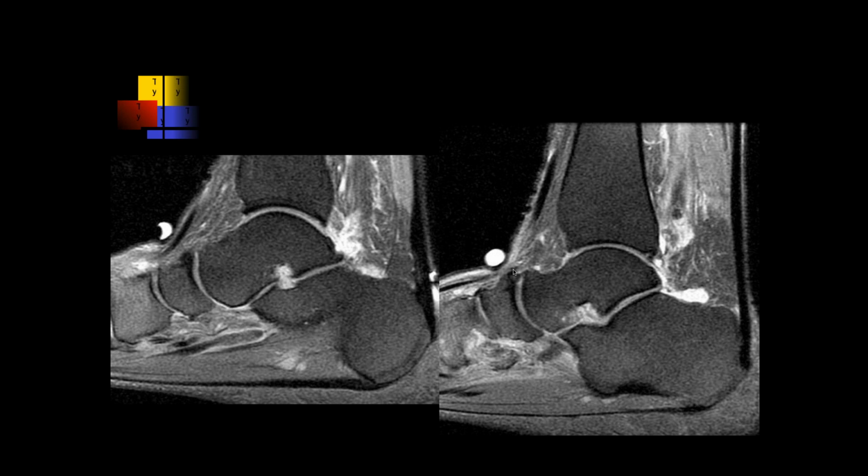What do you do if you see it there, Jennifer? So usually if I see a tear, I describe how far proximally it's retracted and what it's adjacent to. That way, if the surgeon needs to go in and repair it, they know where to look. Yeah, the repair is not an easy one. Sometimes you have to use the foot hamstring tendons; allograft tendons are very helpful, unless you want to use autografts and go for other kinds of tendons, which are not always helpful. But for some reason, hamstring tendons have been chosen for the foot.